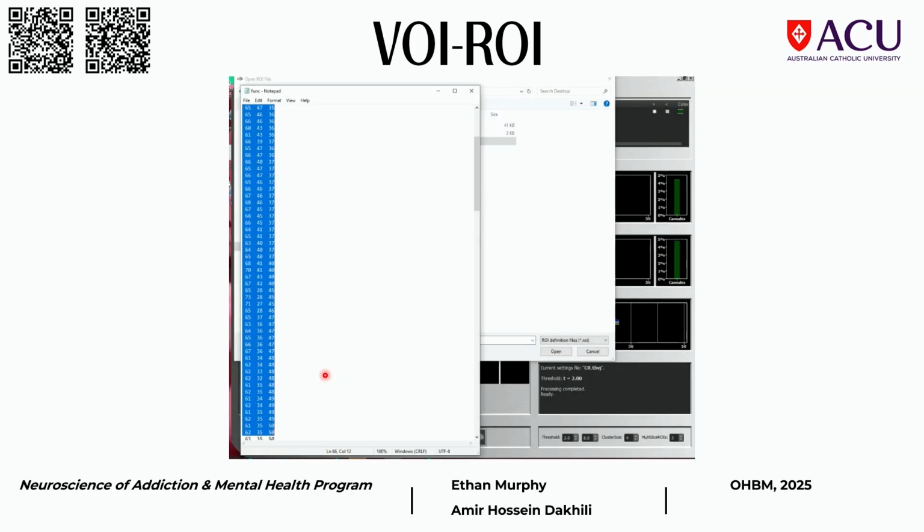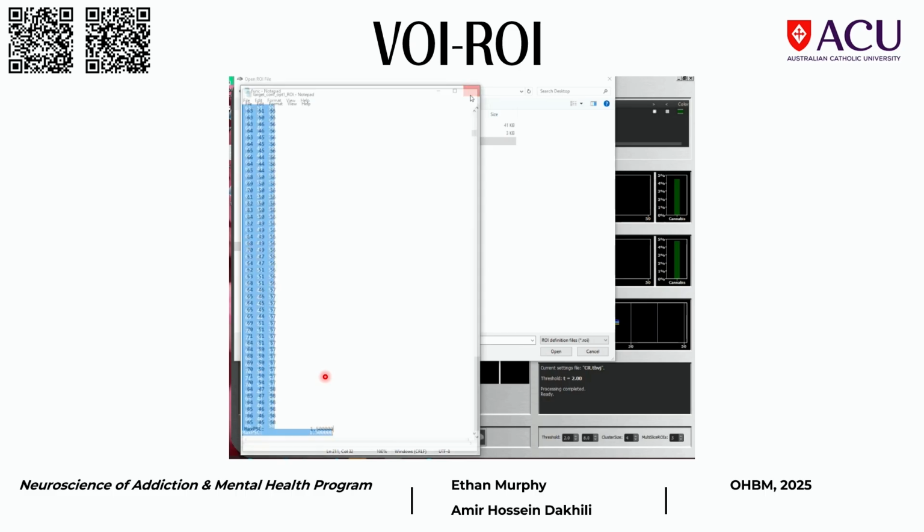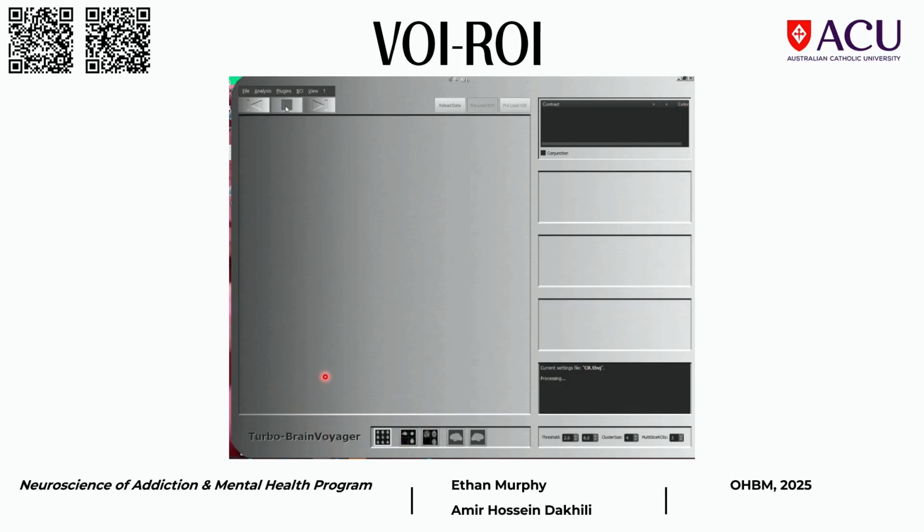So this is the one that you actually found those MNIs from, found the coordinates from the localizer, and now you want to copy them. Maybe I didn't mention that in the presentation, to be honest, that this detailed. So I won't expect anyone to answer, but yeah. So the idea was to copy those coordinates of those voxels into another separate text file, correct? Can we pause it? Yeah, maybe.